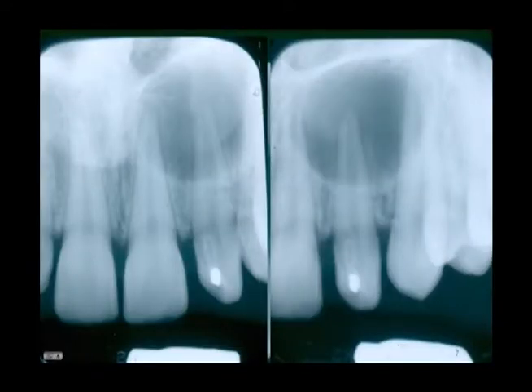The periapicals of this area, taken after the standard occlusal where this was observed, can show the causative factor of this long-standing chronic inflammatory response. One can see a small amalgam restoration in the tooth. It does not seem to be an offensive causative factor.